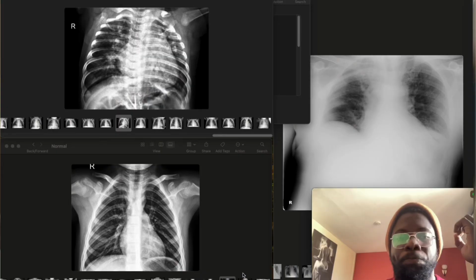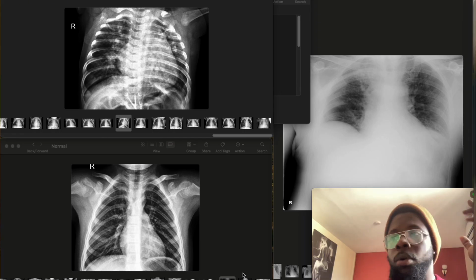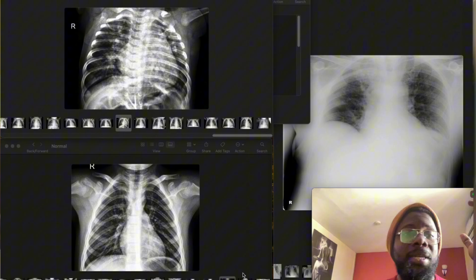Boom, right there. So what we do basically, as we all know, the technological space is evolving, and we can use machine learning models these days to determine if a person has malaria or heart disease, or just go ahead and mention different types of illness. But today we're gonna be focusing on COVID-19. Basically, it's just a sample. The data is gotten from Kaggle actually.